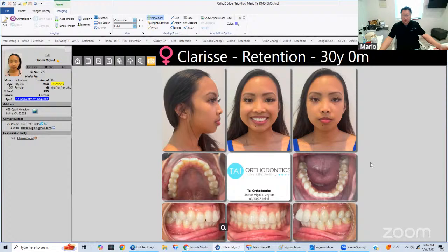With this situation, I wanted to point out a few things. We did characterize this webinar as tips and tricks, but I do want to share with you something that I always keep in mind when I do cases. Let me get to that page here.